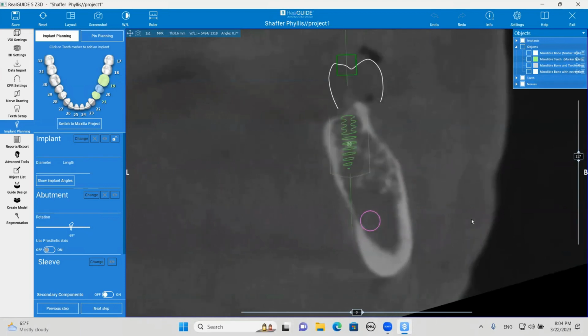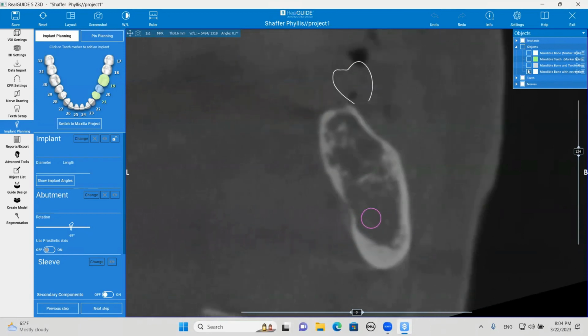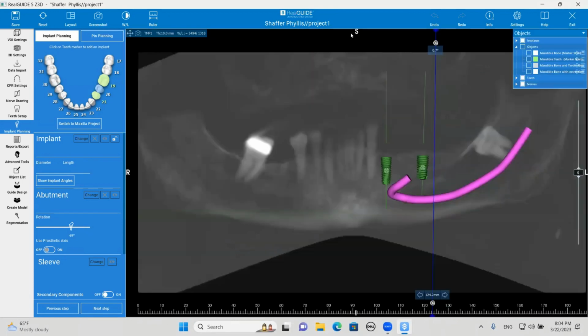Be very careful in a case like this. Let me give basically a warning on this. I see a lot of local labs, smaller labs, that will draw these nerves in, and you have to be very careful. Always make sure that your nerve is in the right position. This is a very difficult one to identify. I would say on a scale of 1 to 10, this is a 12 in difficulty, but as I said, Hussein and Sarah are experts at it. So they're right on the money. So I would say this plan, Nicholas, you're good to go on it.